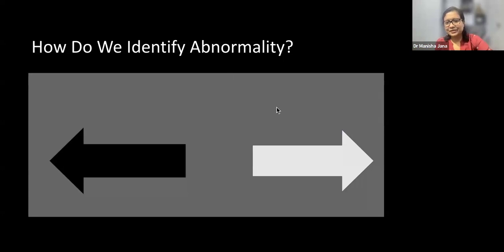In this slide, which is an oversimplification, CT is kind of a black and white palette. Some diseases go to the left hand of the spectrum, presenting as more black or hypoattenuation, like emphysema or cysts. On the other hand, we see more white or denser things like mass, consolidation, ground glass opacity. So broadly, these two types of things we see on a lung window. I'll be coming to the mediastinal window later.